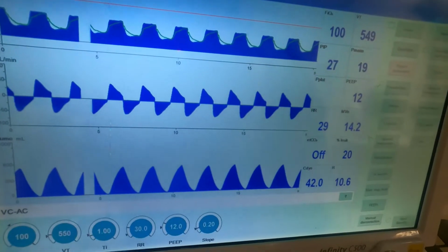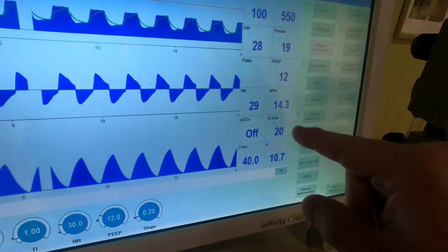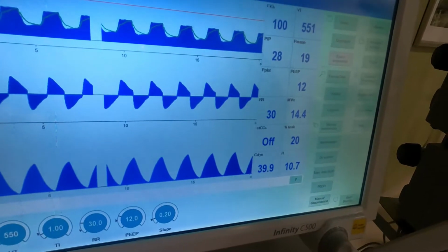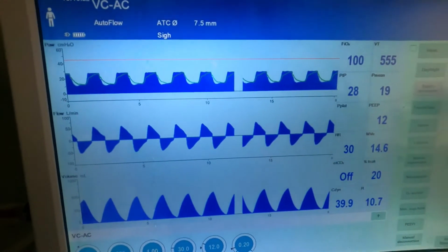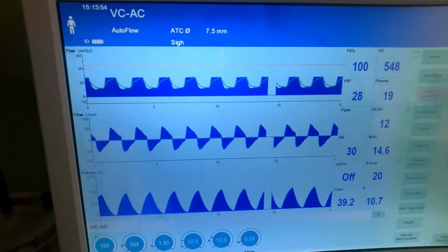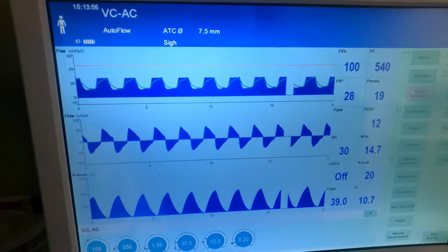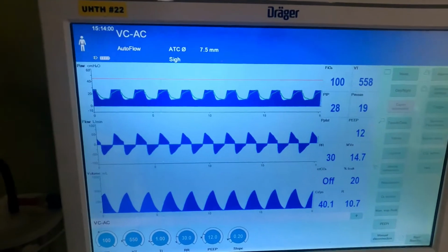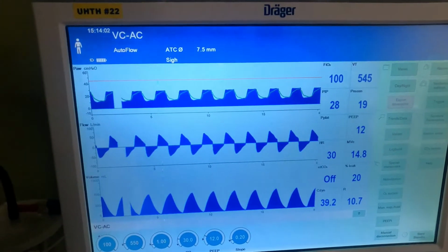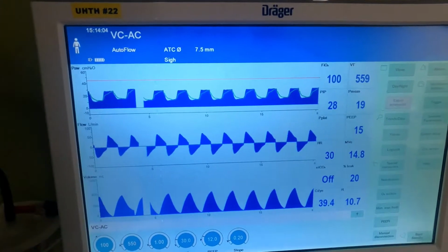So where are we losing? Well, probably losing it in the leak in this case. We would hold more of that PEEP in, but we're losing it inside the leak. This is a rotoprone patient, very ill, of course. But those are just some different things that I look at with these waveform graphics. Let's go take a look at another set.